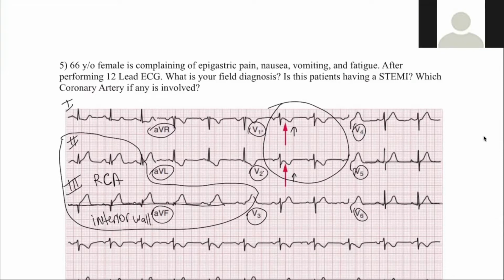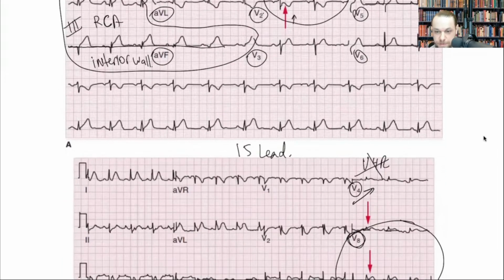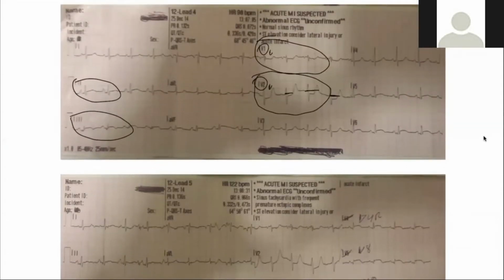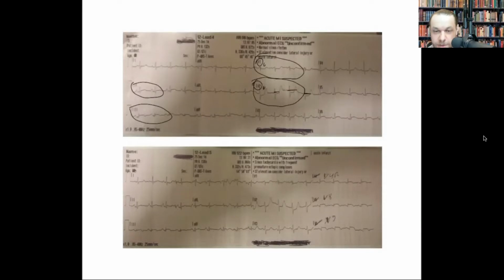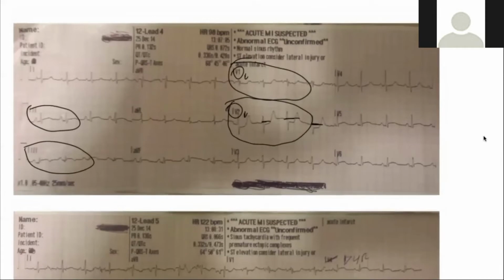Yeah, I've got a quick question. Go ahead. I keep asking. Can you go up? Can you go down? Yeah. The one of the EKGs that you did, right? Keep going, I can't see it on my screen. The one that you did, you see right here, right? This one right here, what's that, V2? Okay. You see some depression, yeah, right? And then in V2 you see an elevation. What is that? Like you see the first QRS complex, you see the depressions, and then right in the middle you see an elevation. What is that?